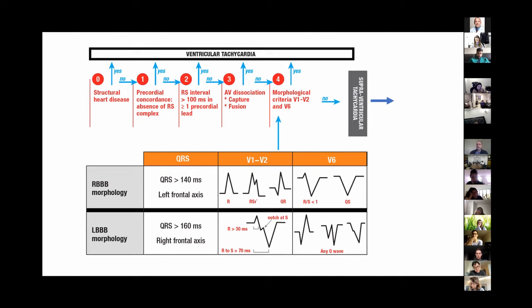And then you go through how that QRS looks and compare to a normal-looking right bundle or left bundle. If you take right bundle, for example, my normal right bundle should have a small R wave first, then my S wave, and then a big R prime.